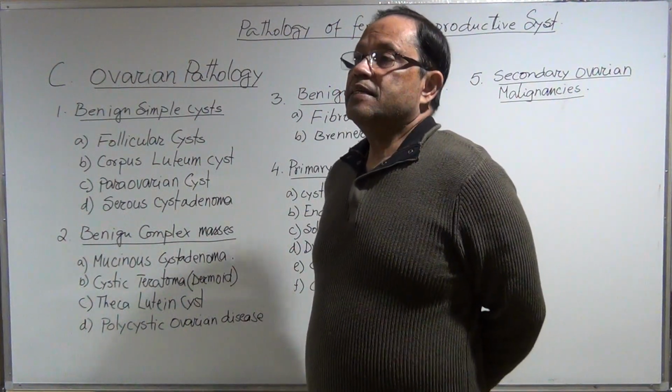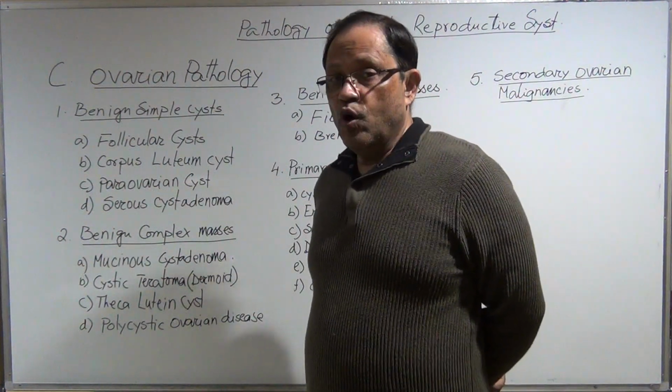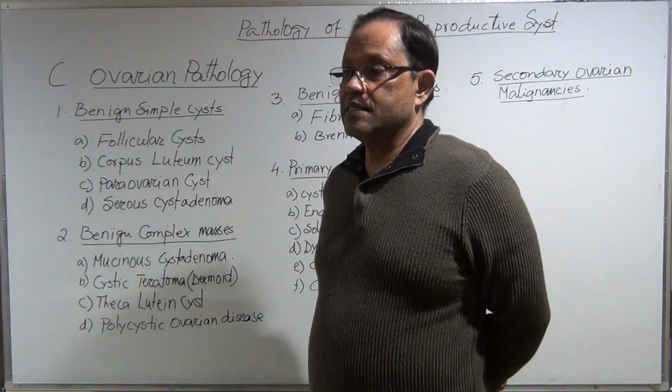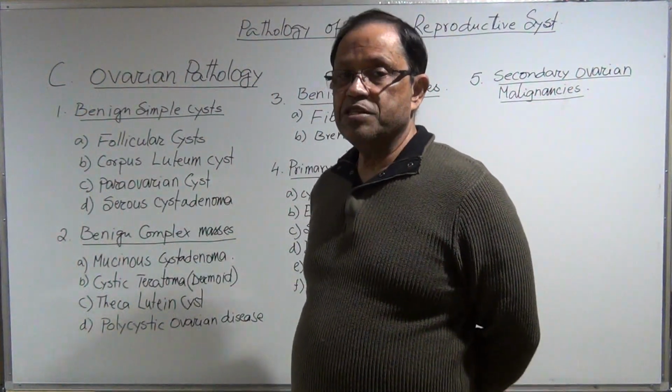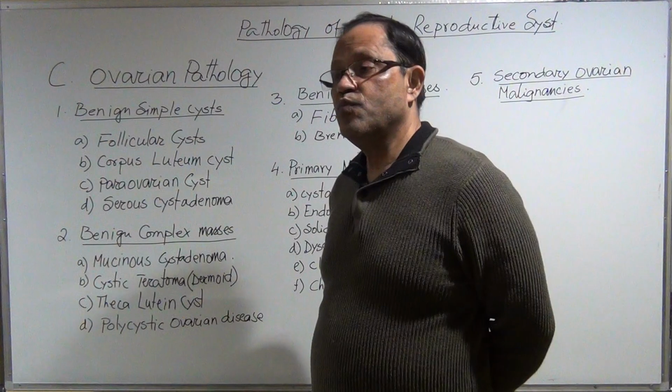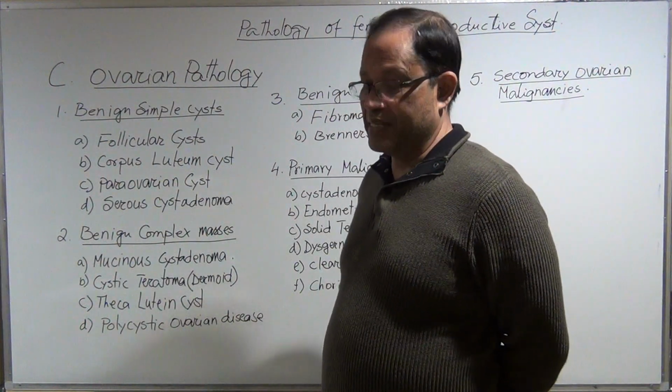Okay? And do I need to measure the cyst? Yes. Even if the whole ovary is taken by the cyst, you still need to measure the ovarian dimensions and the follicles. You need to measure in separate images.